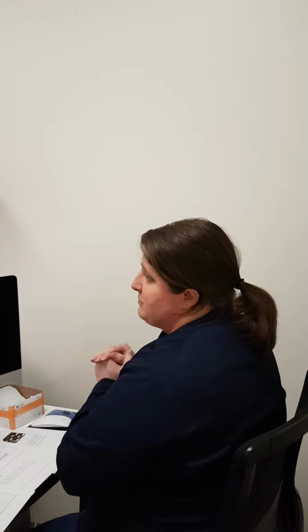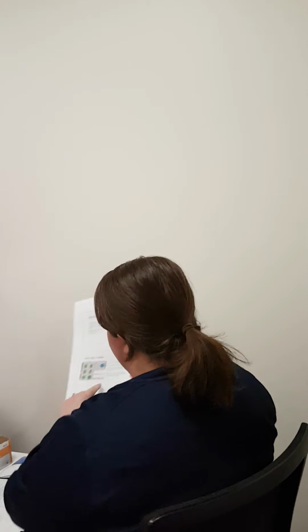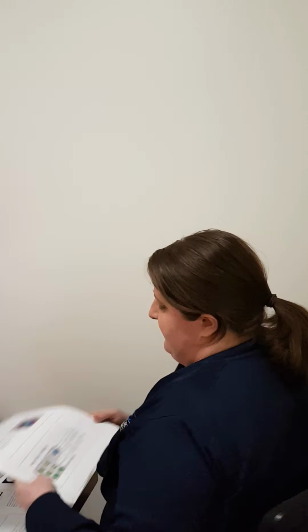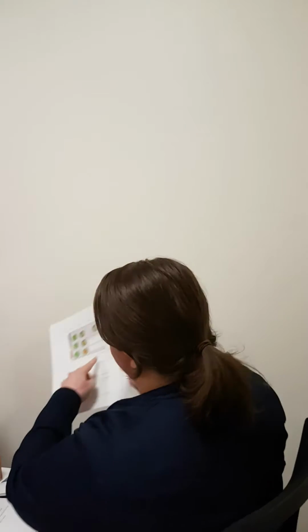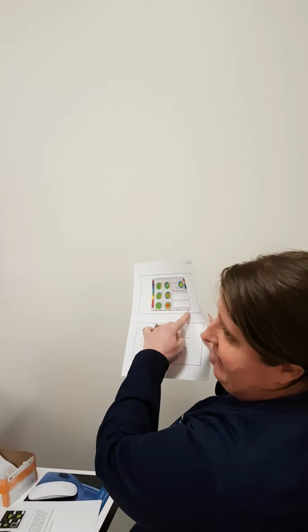It also creates a D value, which Dr. Mayer looks at specifically for help determining risk for ectasia and keratoconus. It's in the bottom right-hand corner of the Belin map, and you can see on that initial slide I was going over, down in the corner, it's white, that's your D value, and in the next one, there's a red area there, okay?